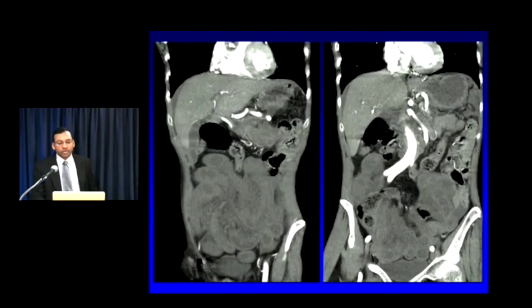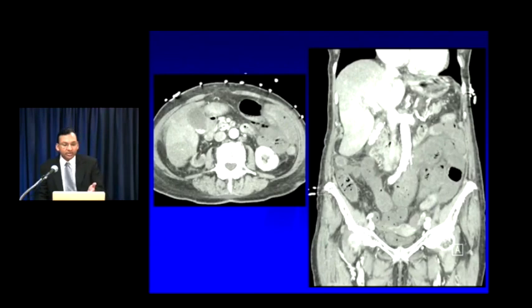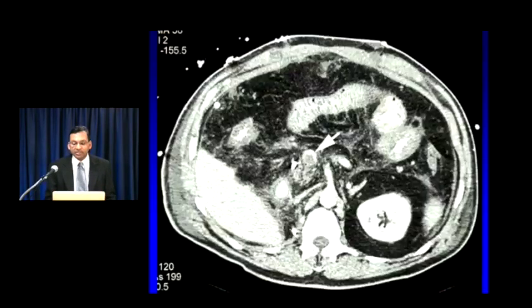Here's an example of arterial occlusion. There's an SMA embolus, and you can see that the small bowel is diffusely hypoenhancing. There's really very little bowel wall enhancement. This is acute mesenteric ischemia. Here's another example. This patient has clot in their SMA, as you can see. Much of the small bowel is non-enhancing or hypoenhancing, and you can juxtapose that abnormally enhancing bowel with a more normally enhancing bowel in the left upper quadrant. Again, arterial occlusion-related mesenteric ischemia.